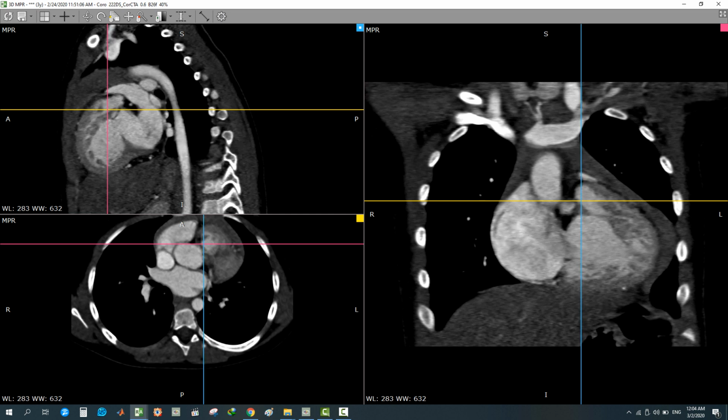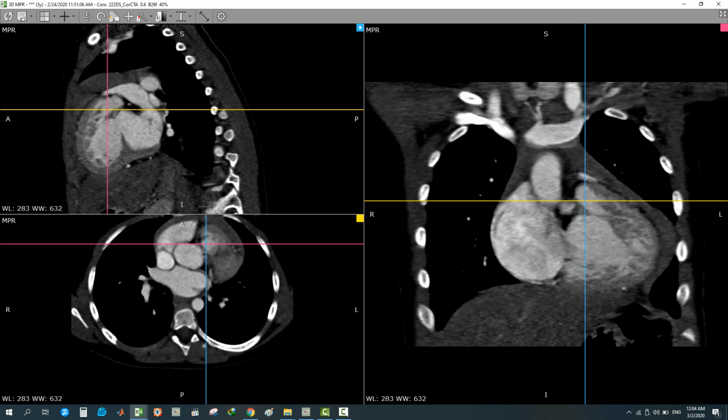It shows mild to moderate infundibular stenosis, not tight stenosis, and always assess the RVOT in end or mid systole, or in the systolic phase in general. Don't assess it in diastole. It will be near normal in diastole, but it will be obstructed in systole. Choose your sagittal plane, systolic phase to assess the RVOT. This one, the RVOT, shows mild to moderate, almost mild infundibular stenosis.